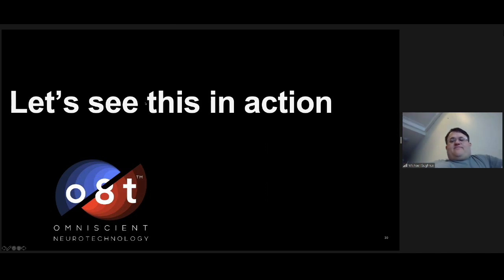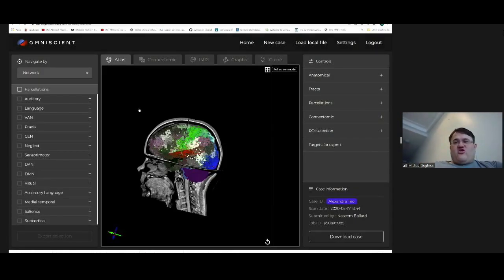Okay. So what I'm going to do now is I'm going to take over the screen, and I'm going to quickly walk through the viewing platform on the software. And if you have a password and are able to log on, it would be helpful if you followed along. I'll try to go slowly.